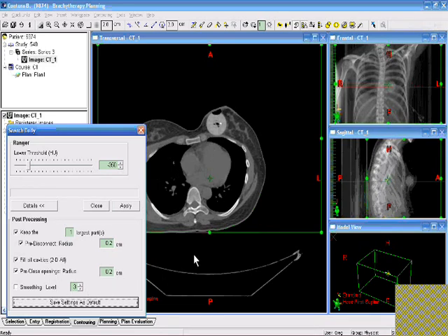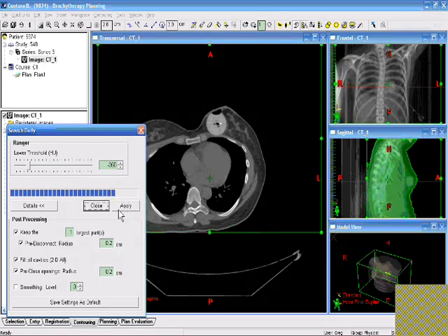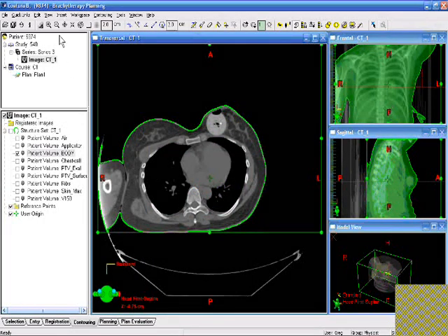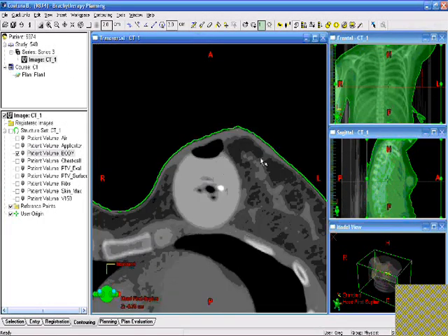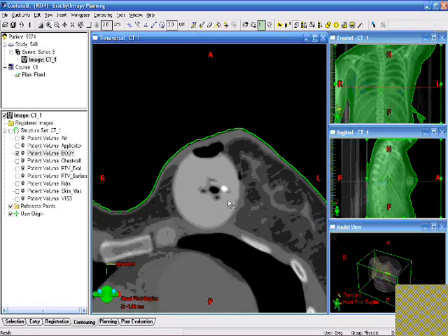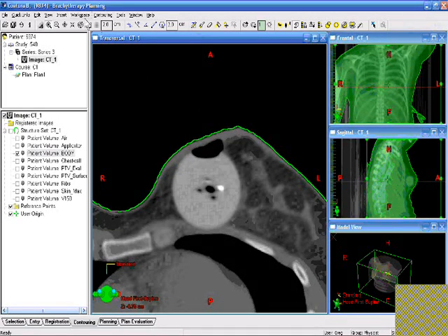It is possible after you do the body contouring, or after it automatically does it, to come back in post-processing and do that smoothing, and it'll actually improve the contour rather than making it worse. But let's look at what happens if we create it the proper way without that involved. There's another little bug here that the progress bar doesn't finish. Let's zoom in and see where it's fixed at. And of course, it's now correct, although it's a little ragged, as you can see.